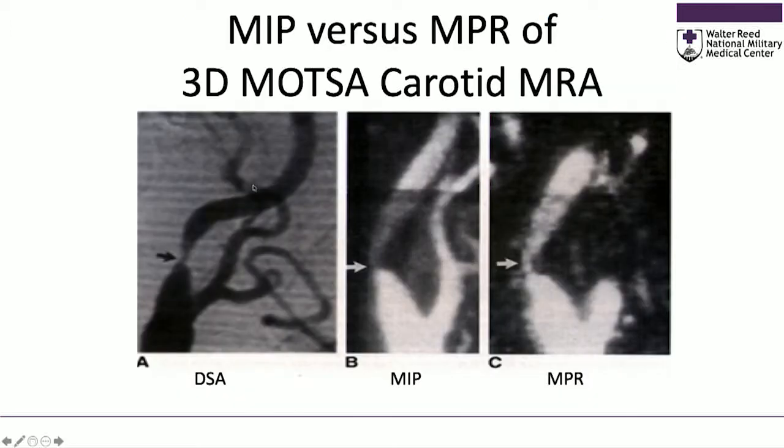The other thing I wanted to describe with you guys is measuring the stenosis. And again, from my initial work in San Diego, we started off, as everybody was at that time, measuring off of MIP images. But notice that the edge of this vessel is very ill-defined, and it's hard to measure. And so when we did multiplanar reformations, it has higher contrast to noise, especially in areas of low flow related enhancement, and it was much easier to see the wall.